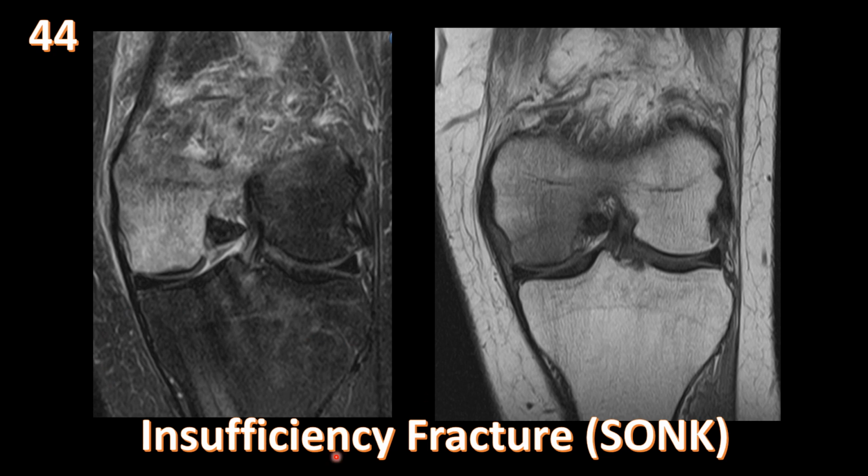So we should call it an insufficiency fracture of the medial femoral condyle and not SONK. But this is what we see, this subchondral fracture here, right in the weight-bearing medial femoral condyle with extensive edema around the condyle extending to the metaphysis.